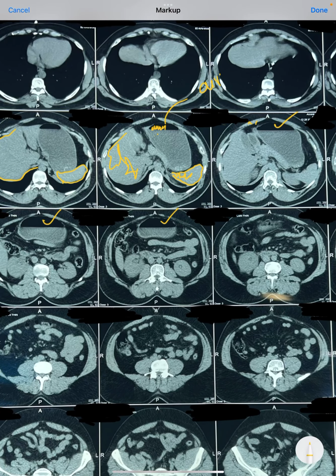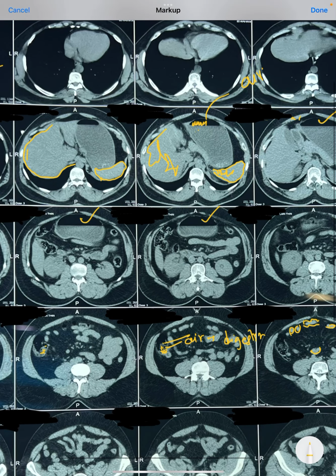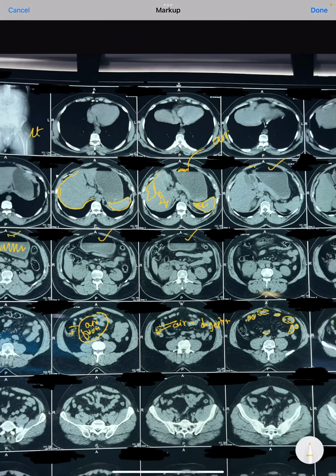When you go behind them, the next thing we should see is the intestine. The intestine is very easy to find out. These will be round tubular structures. This is all part of the intestine. This is collapsed because there is not much food in it. And see, this is also intestine. These white and black dots are air. This is because of the digestion of the food, and some part of this is food. These whitish patches are all food. So this is food, this is air, so this is intestine.